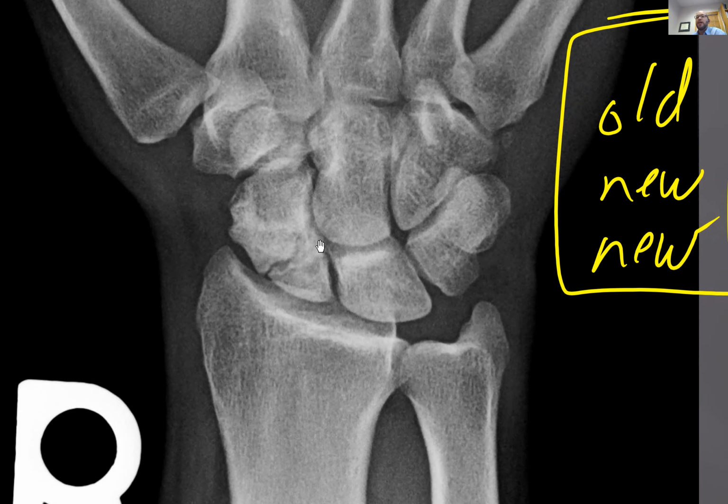So I would favor old here, because if you look at the edge, yes, it's irregular. Yes, it hasn't healed. All of that's true.